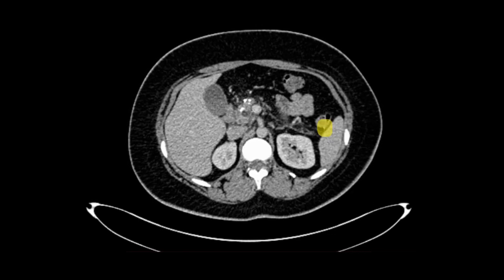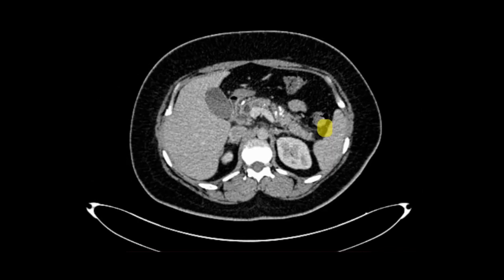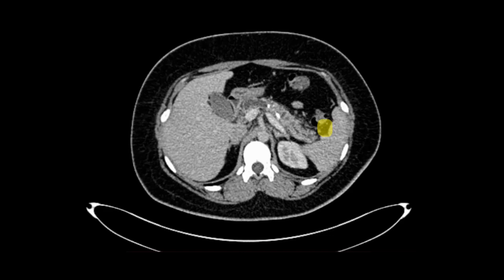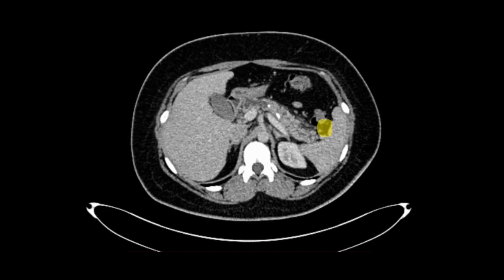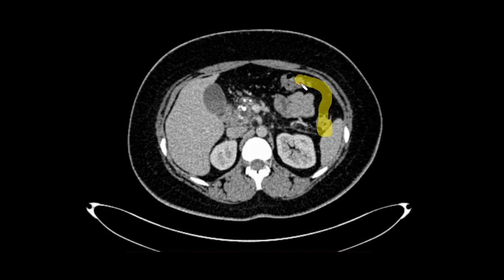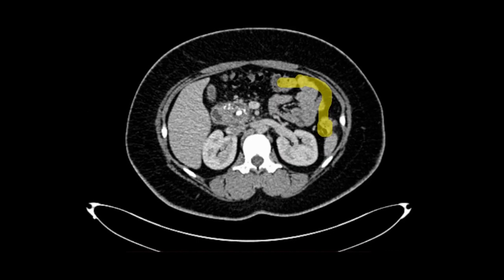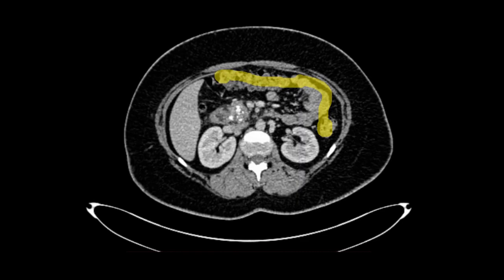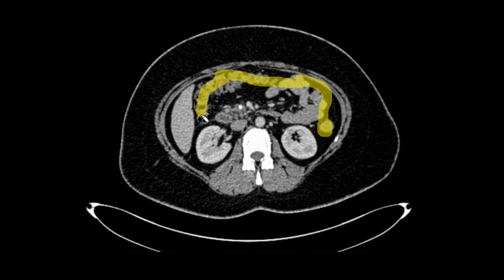Again, as we go up, you will come towards the spleen, and that is the splenic flexure, right? Therefore, this is the splenic flexure, right? So now you can see, right? I'll show again. This is the splenic flexure, and this is how the colon is turning from here to here. So as we trace it, just keep moving console front and back, and you can trace the entire transverse colon as well. This patient does not have any pathology in the colon. That is why I selected this scan just to trace the colon for you, right? So this is the entire transverse colon.